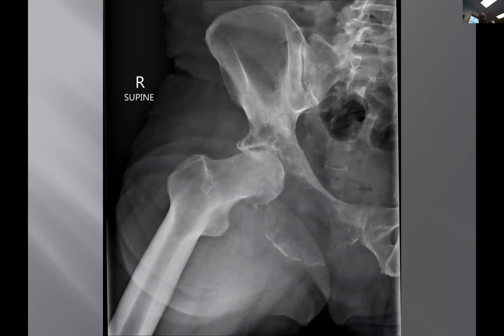Now this guy, you'd say, how could he just have pain for 2 days? Well, as a point of fact, he had some dull pain in his hip for quite some time. But why did he have acute pain? I'll tell you why. This is spread up into the supra-acetabular region. And so, of course, with weight bearing, you're probably getting a pathologic fracture through that weight-bearing area because it's expanding. And he probably path fractured through it, and probably that's what discovered it.